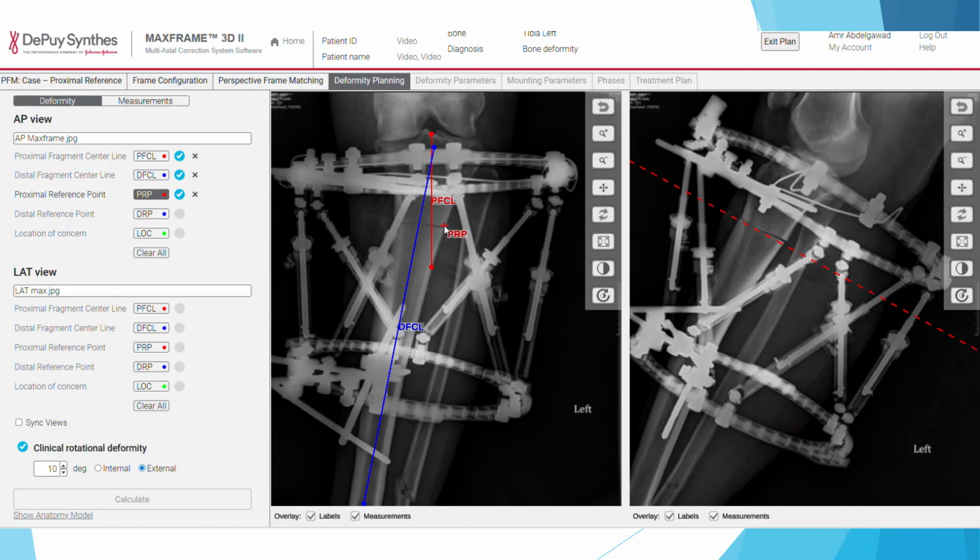And if you notice when I did this, the line here gives you the line of where this is on the lateral view, so that when you come here for the proximal, it's much easier to use it in the same spot, so it does not confuse the computer. Okay, so when you put that line, it gives you this line here, and this line is very close to the proximal line, so that means that you picked both of them very close to each other.